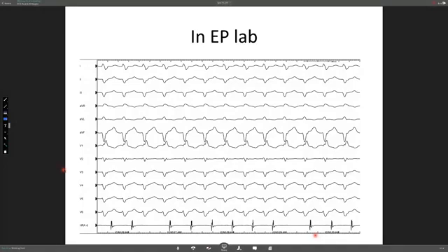And this is why it's sensitive to calcium channel blockers, and it can look like a typical right bundle or typical left bundle, and it does tend to be narrowish, or it can be just slightly broader. So that's why fascicular VT is one of the VTs where it can be extremely difficult to differentiate from SVT with aberrancy. And this is why it's been noticed that it's sensitive to verapamil, because it originates from the fascicles. So that's the answer. Anything else to add, Fathi or Yousef?